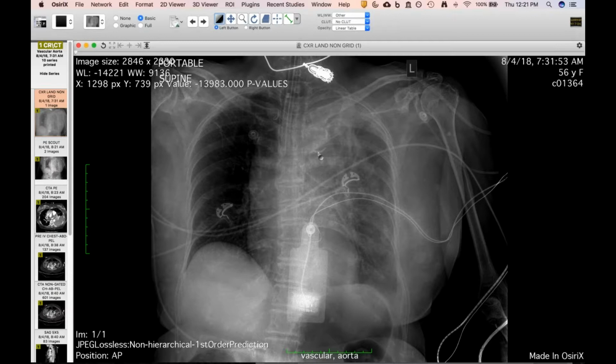This is not a trauma, but you can see the calcification, but we really obscure the aortic arch, and then you see what I think is a pretty impressive example of an apical cap. So this hematoma traveling along the left subclavian artery and along the apex of the lung. You really lose the left pulmonary artery as well.